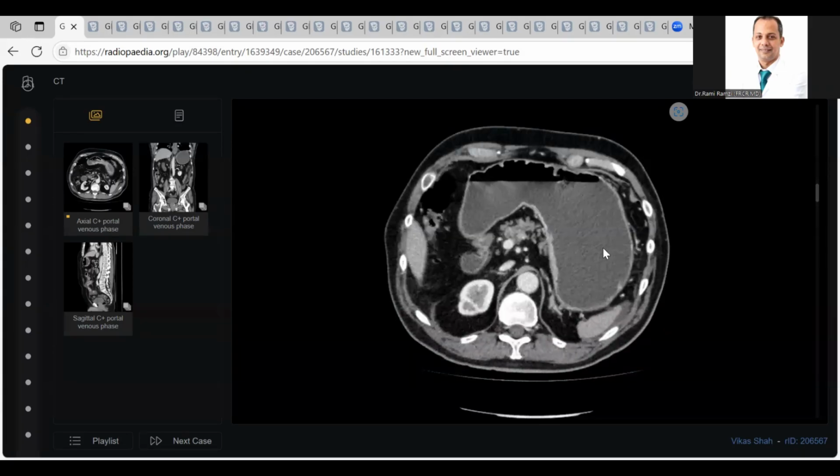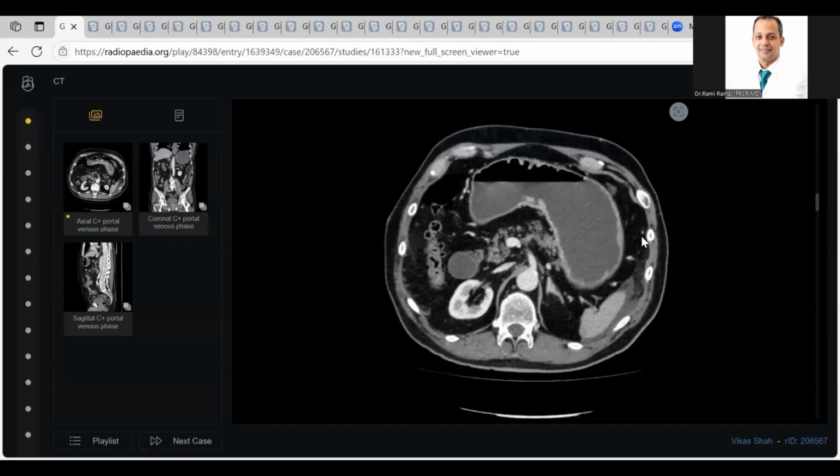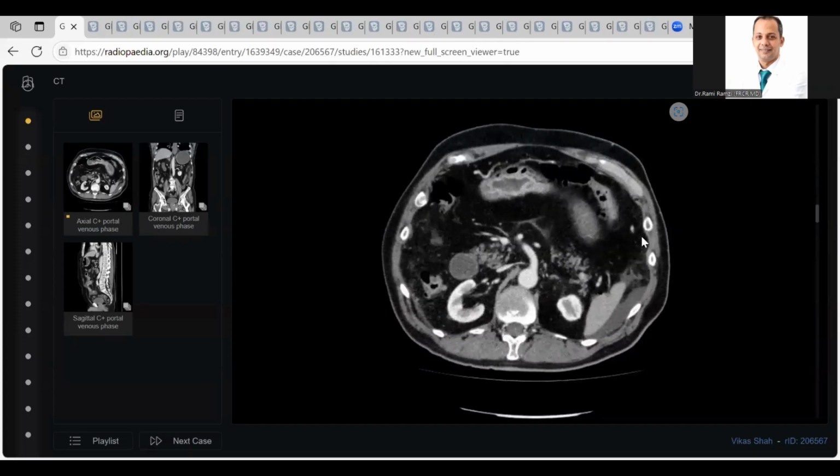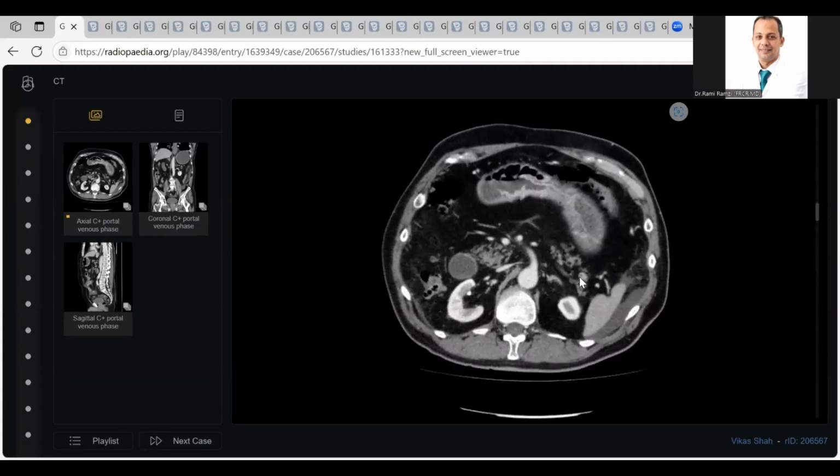This is, I think, calcification, because we didn't have pre-contrast. And at the tail, the pancreas in elder age is very important to examine because it is tricky. See here? So, a hyper-enhancing pancreatic lesion plus perforation equals Zollinger-Ellison syndrome or gastrinoma. What will you do next?